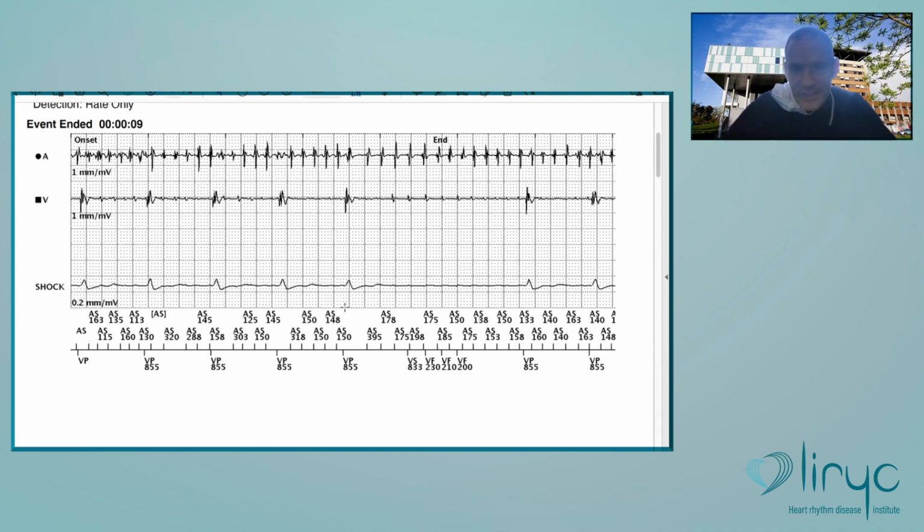You see the pause here? So the patient was symptomatic. It's not very long here. By chance, there is a diminution of the amplitude of the signals. Therefore, the patient did not have syncope, but at least a minimum of hypotonia.